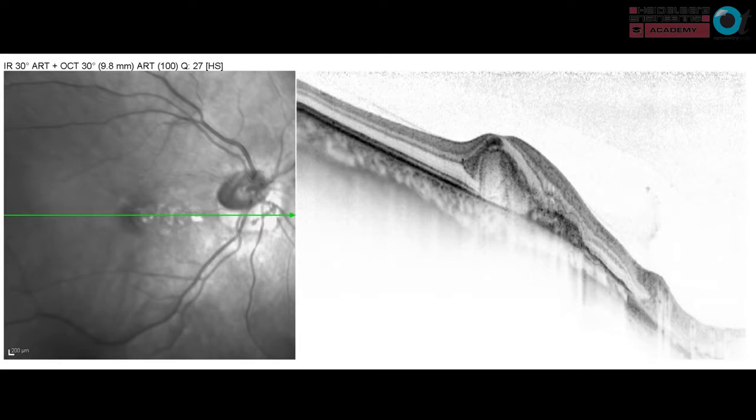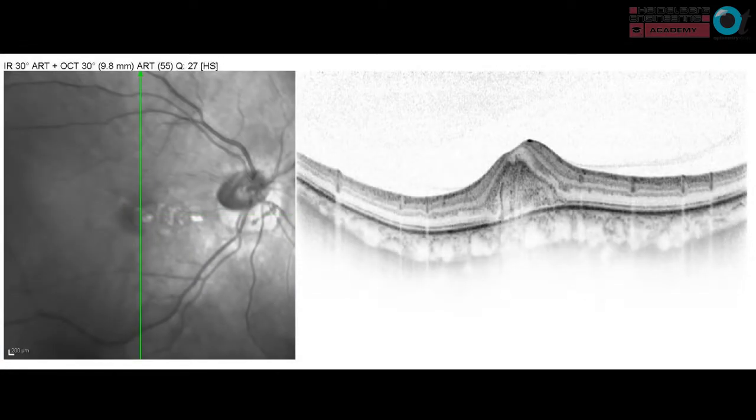So just be very cautious in patients with choroidal neovascularization. Listen to the symptoms. Yes, do an OCT, but if the OCT doesn't show much in the way of macular edema, that patient still needs prompt referral to hospital because they don't seem to leak as much as, say, in age-related macular degeneration. And this is a vertical scan of that same patient showing an abnormal elevation centrally with this hyper-reflective lesion beneath the retina that again represents the blob of hemorrhage in the subretinal area.